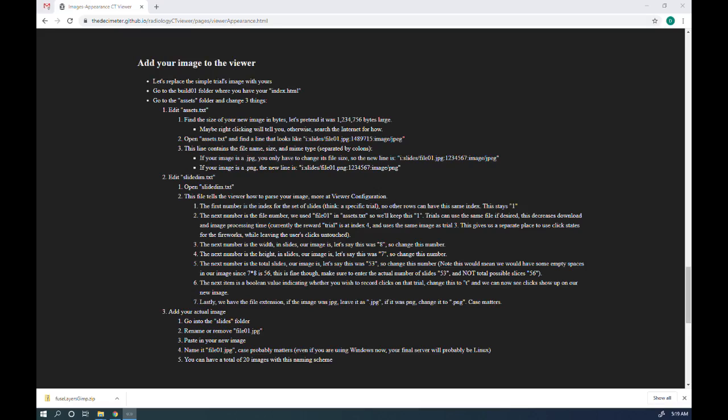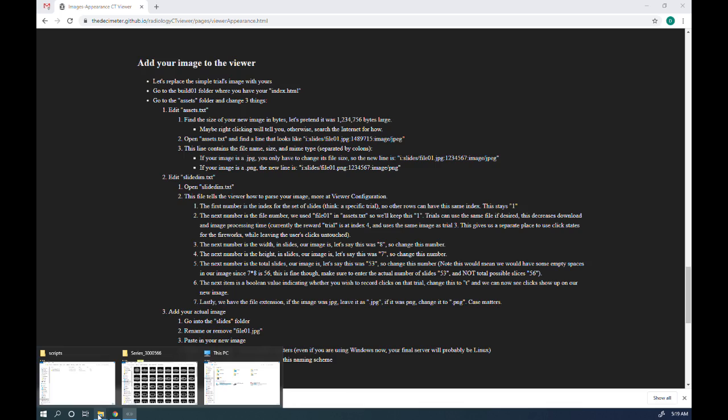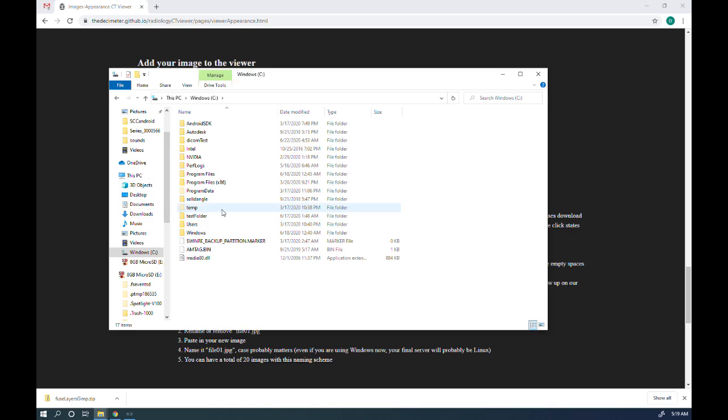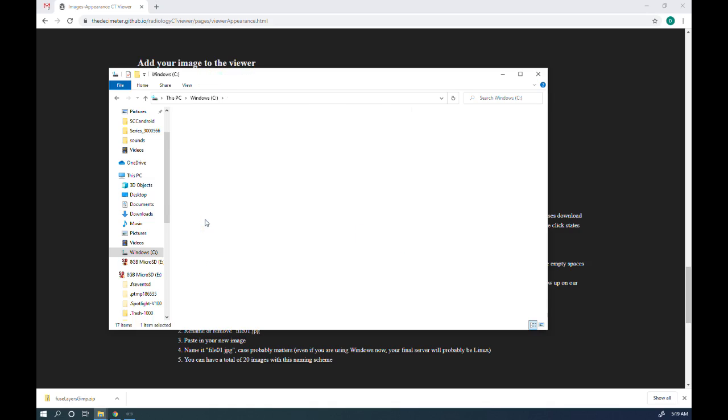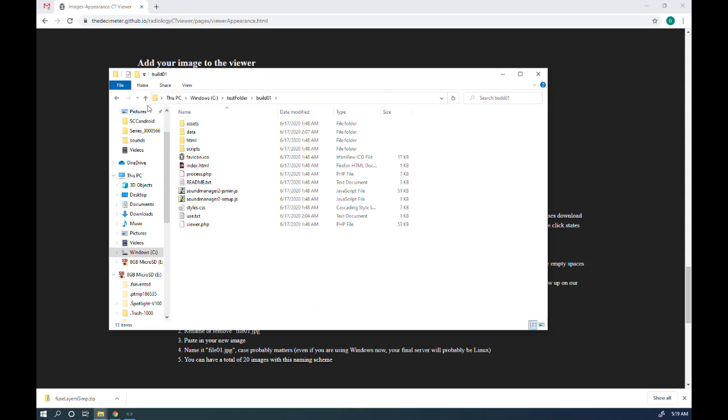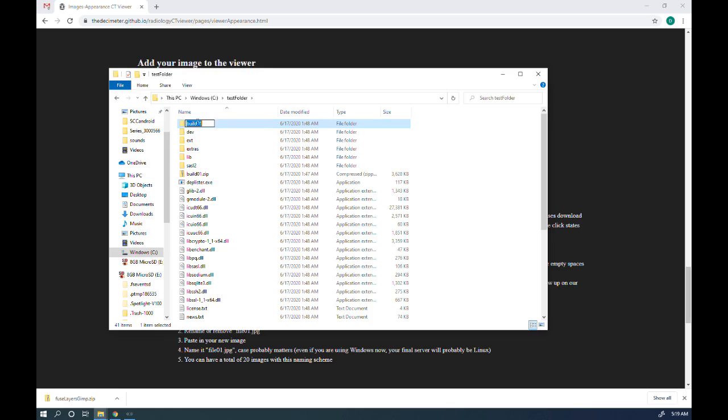This is the third video in the pipeline of moving Dicom images into the online CT viewer. So in the last step, we're going to take the grid we just made from the previous tutorial and move it into our server. If you remember, when we set up the server the first time, we made this folder with all of the PHP files and our build.